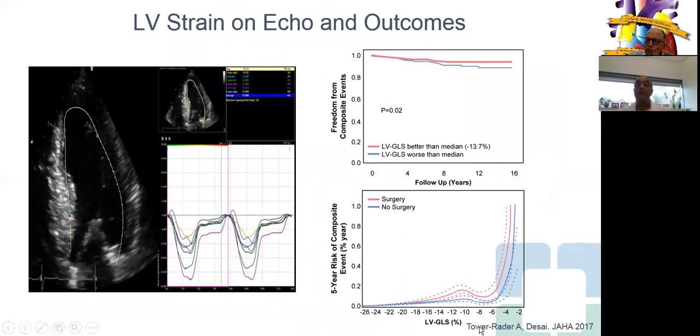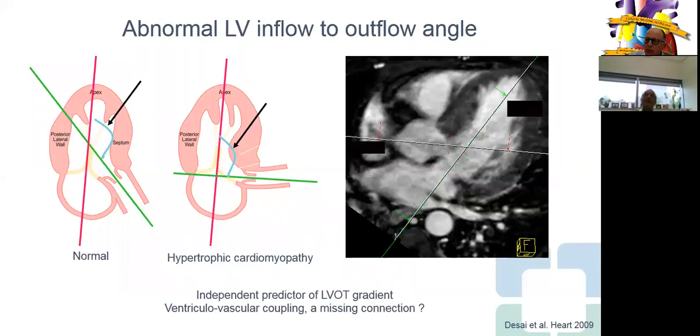This large study, published a couple of years ago now, showed that assessment of global longitudinal strain can help identify and risk stratify hypertrophic cardiomyopathy patients. And using advanced spline analysis, we can even derive thresholds beyond which the incremental prognostic value can be ascertained. This is an interesting thing that we saw. I think this paper was a little bit ahead of its time.